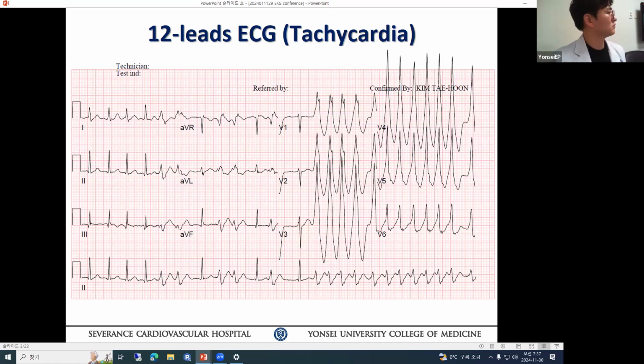커플링 인터벌에 따라서 QRS가 넓어졌다 좁아졌다 하는 걸 보고, SVT의 프리엑사이테이션 아니면 어버런시 둘 중에 하나를 보고 싶은데, if it is aberrancy, we can see the Ashman phenomenon. Here, at the long R-R, then wide QRS, no. So R interval is similar. So it is less like the Ashman phenomenon. But if we see this point, long R-R, then wide, still I cannot exclude the potential aberrancy phenomenon. But my first choice is atrial fibrillation with pre-excitation.